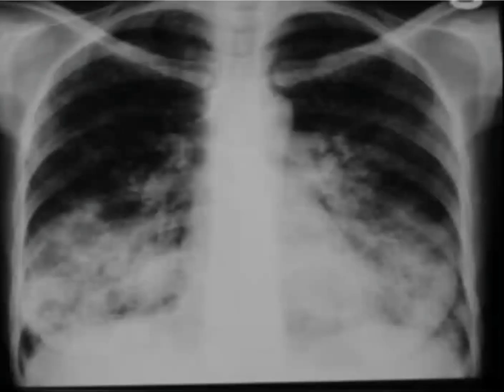So let's look at the diagram here. First thing you need to take note of is the heterogeneous opacities here. Are you able to see this? Yeah. So these are heterogeneous opacities, and you can notice that they're present bilaterally. Then you're unable to appreciate any air bronchogram here. And then one thing we said is that pleural effusion or empyema, cavitation, pneumothorax, and atelectasis are common. So you shouldn't be surprised if you see a bronchopneumonia as well as a pleural effusion.